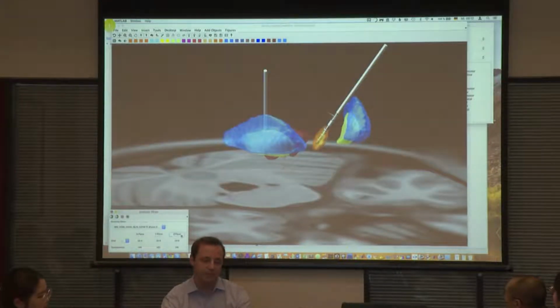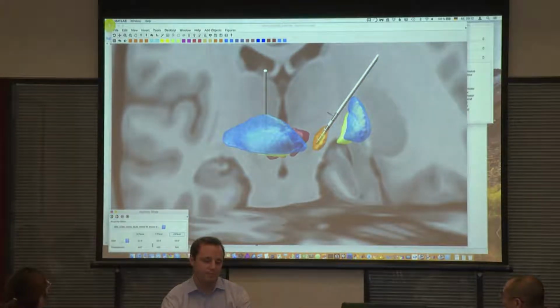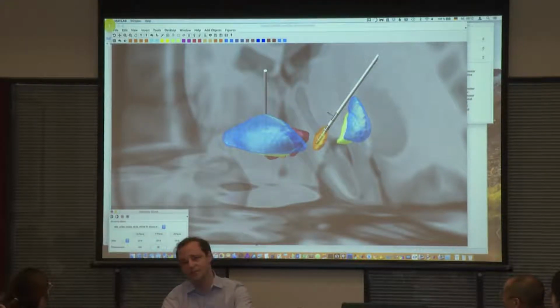We can say we only want to look at the electrode itself without any anatomy. Or there's also transparency. We don't use that much, but you could set this to 20%, or maybe let's say 50, then it's a bit translucent, right?